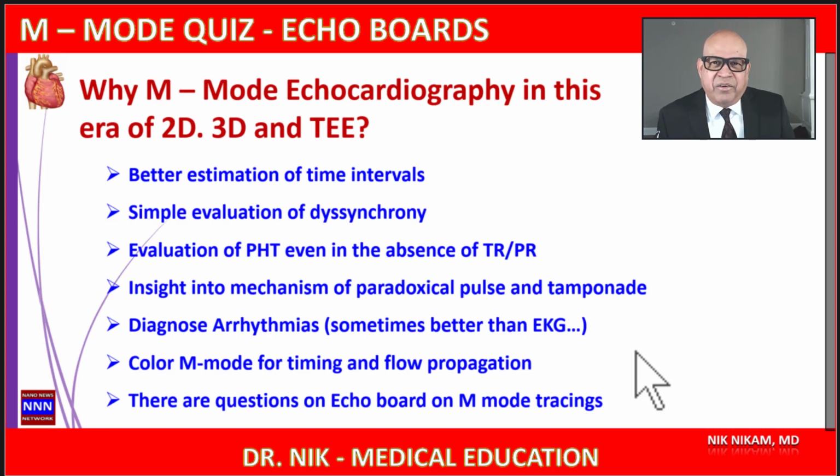And the real reason is there are going to be some questions on M-mode on your echo boards. So that's the reason you need to learn about M-mode. But I enjoy M-mode because it gives us a very precise insight as to some of the mechanisms of wall motion abnormalities, and also as far as timing of various events are concerned during a cardiac cycle.